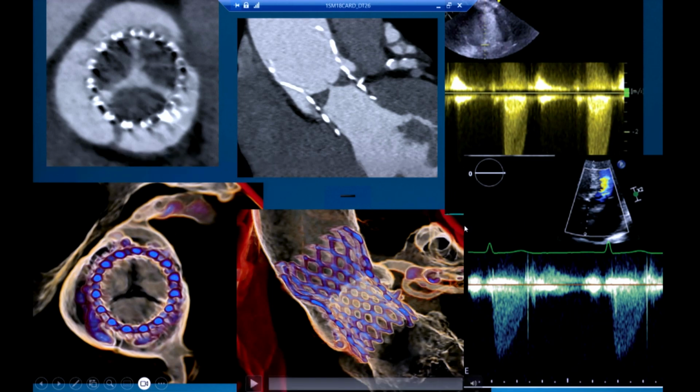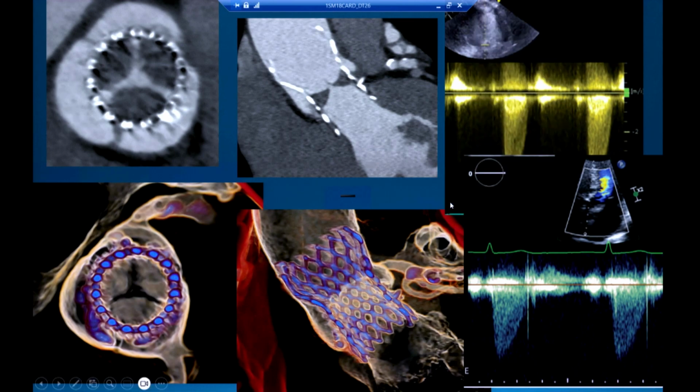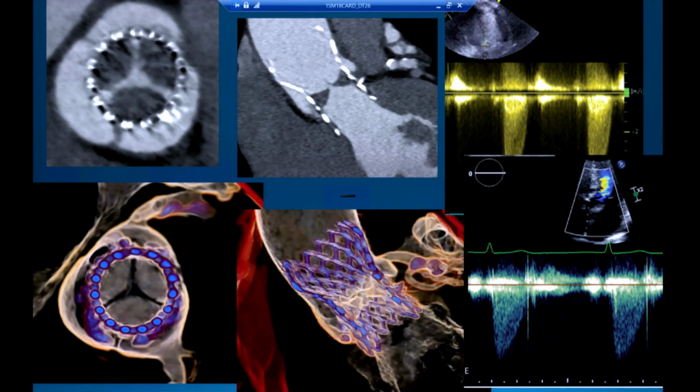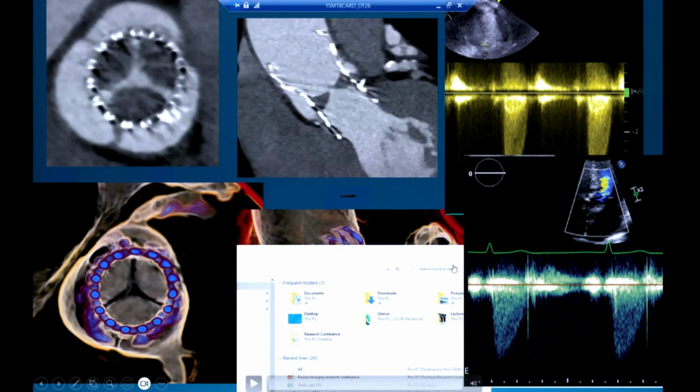I think one of the interventional fellows published this case in an ACC case report. And 3D rendering. Again, we don't always get a 3D image like this, depending on the image quality.